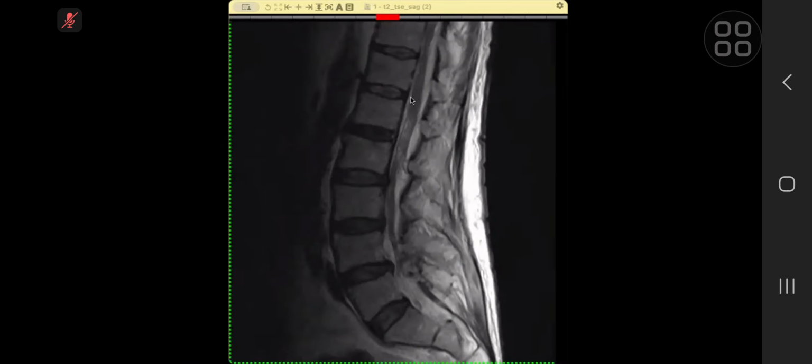This patient came to A&E, 76, male, alcoholic, severe back pain, raised inflammatory markers, and the orthopod saw it. They have written cauda equina question mark. So they're worried about cauda equina syndrome. Over to you. Can I ask for the remote control? Yes, please. The control is with you.